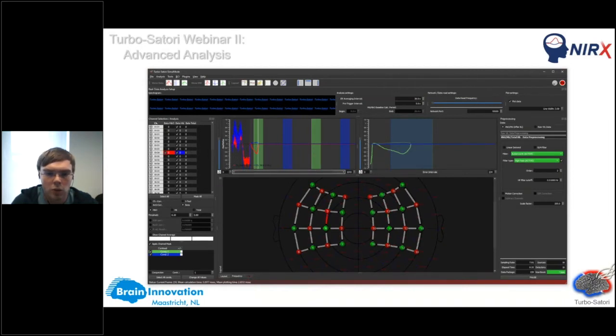And this you can do just by clicking on this channel or using the channel selection bar. And what we nicely saw last time is that if you select a channel and use the neurofeedback experiment, you can use this as a neurofeedback paradigm. But here in the background, we see the green and blue conditions. Just to make it a bit more clear, the green condition is left tapping and the blue condition is right tapping. So we also give some information about this.